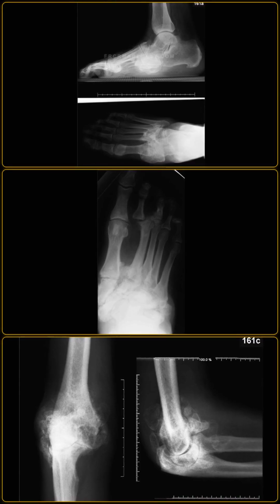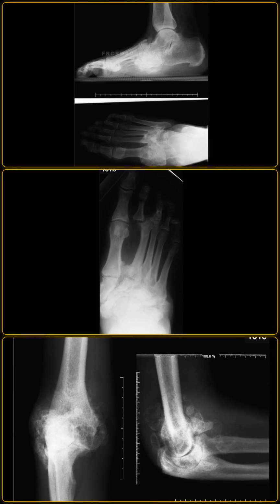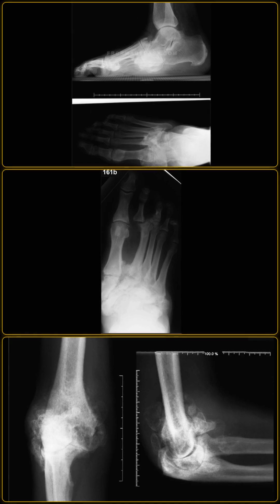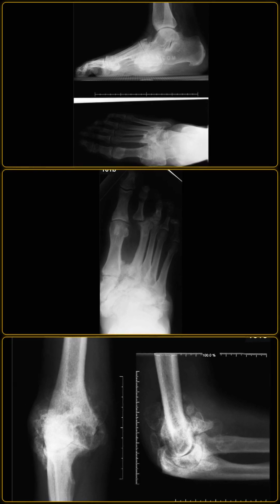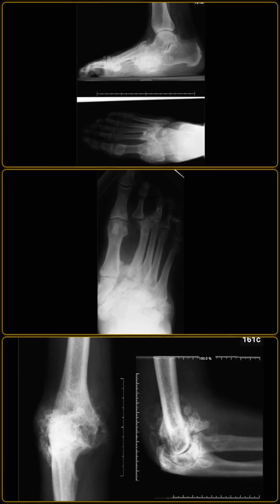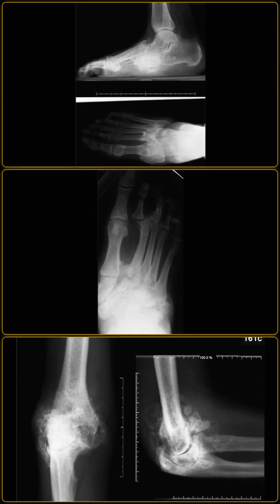The second comparison radiograph demonstrates a Charcot elbow in a patient with syringomyelia. It shows advanced articular destruction, dense subchondral sclerosis, and florid loose body debris within the elbow joint. Both cases highlight the classic 6 Ds of neuropathic joints: distension, density, destruction, debris, dislocation, and disorganization. Discuss the clinical presentation and why bone mineralization is characteristically preserved or increased in a Charcot joint.